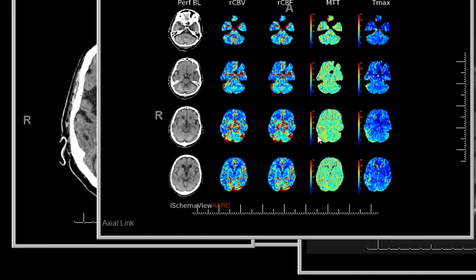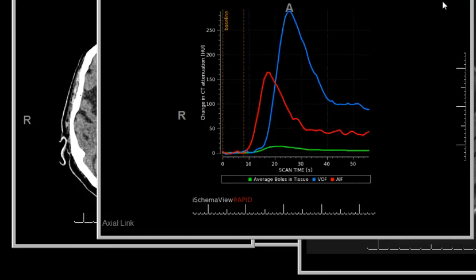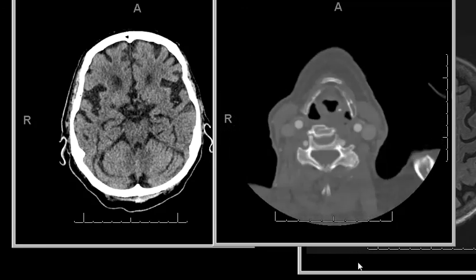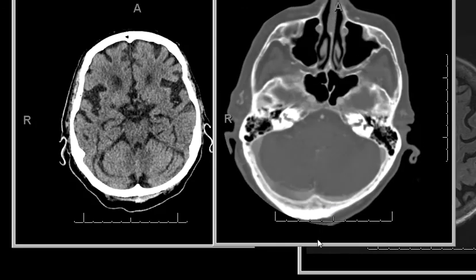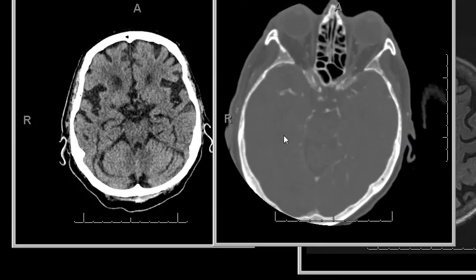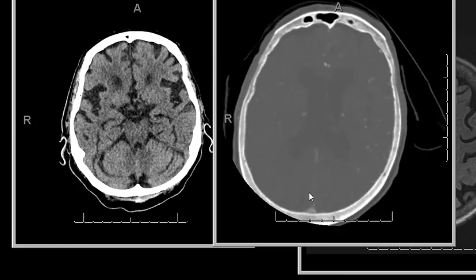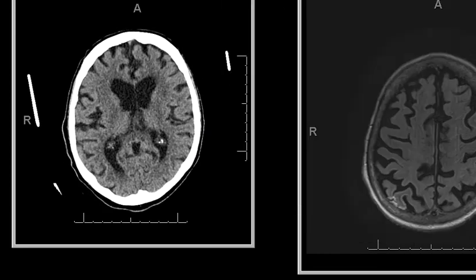It's hard to tell. Quality of data is good, and the CT angiogram looks pretty good. Just a lot of atrophy and white matter disease.